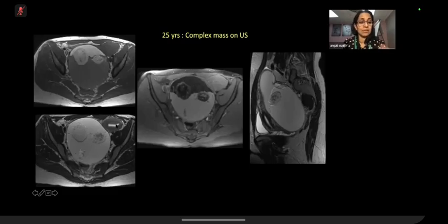So sometimes you may not have anything. Look at the spinal canal. You may see fluid within the spinal canal. You may see a little bit of bladder somewhere. So look for clues to identify the image.